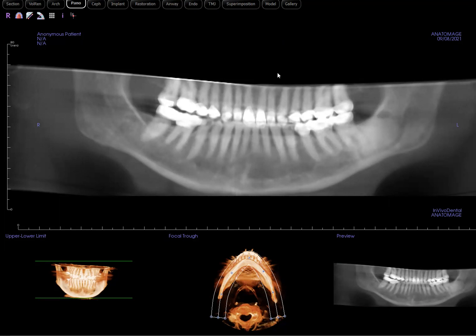So this is a case, unfortunate, I guess, for the patient who is a female in her 60s. When you look at this patient's reconstructed panoramic radiograph, again, this scan was taken outside of our clinic. We see, or at least I hope you see, an altered trabecular bone density in the area of missing tooth number 17.